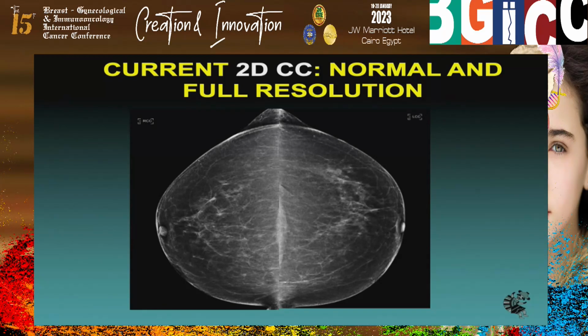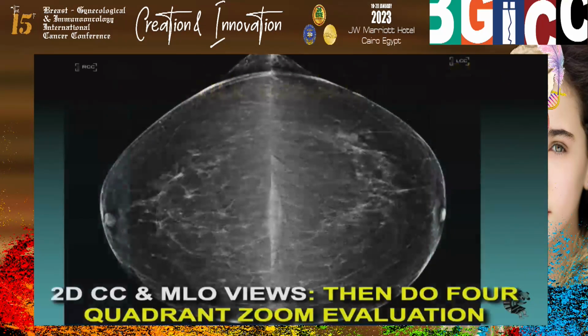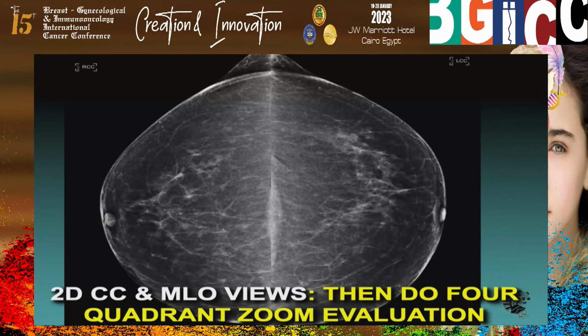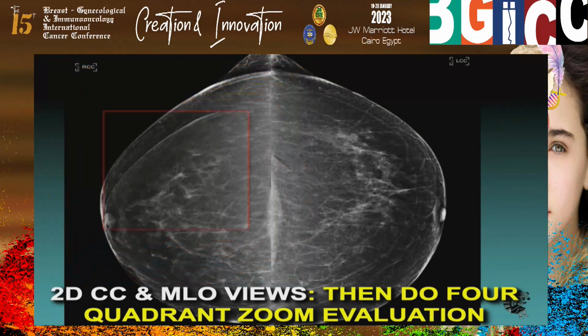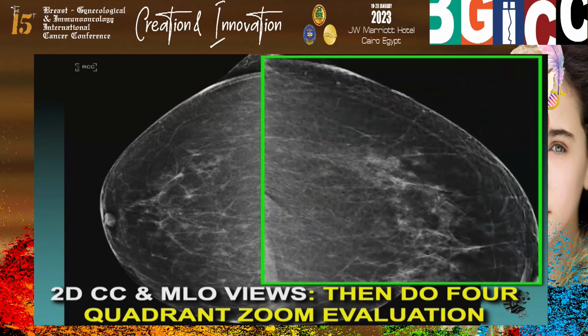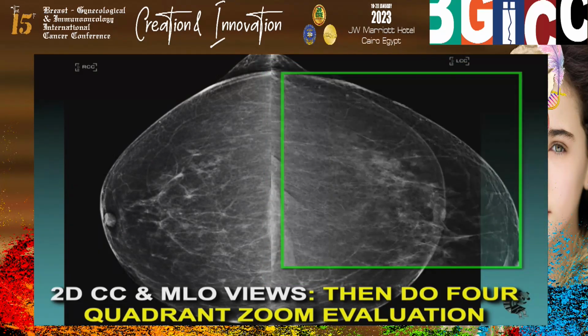After I review these at full resolution on the current study, I then do what I call the 4-quadrant zoom evaluation, looking for small masses and calcifications in more detail. And I do that by individually looking at each quadrant both on the CC and the MLO views.